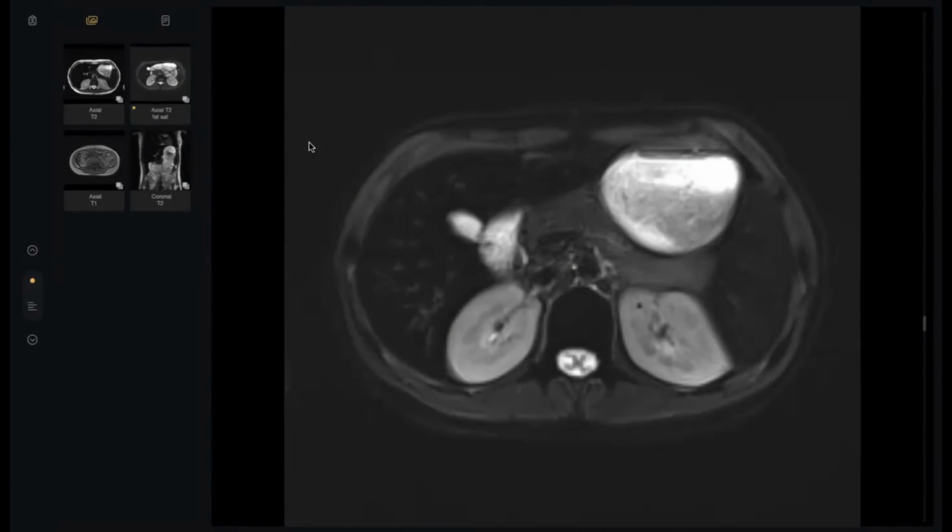It is secondary hemochromatosis because the pancreas is not involved, and the spleen and liver are involved as well. And there is another organ involved in this slice: the vertebra itself. Excellent. So this is a secondary hemochromatosis. Why? There is dark signal.